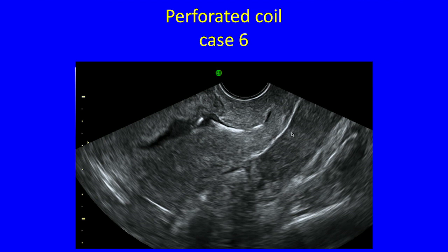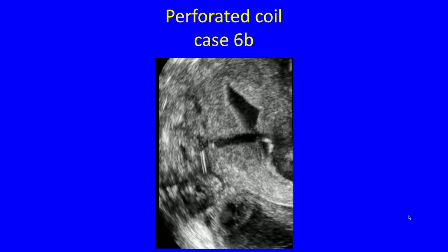And this one, coil strings, you can often see the strings really clearly, and you have to be careful that what you're calling coil isn't threads. If you're saying, the coil's in the cervix, just be sure that that's not thread you're looking at. I mean, it could be in the cervix. But here, we could see something bright here, just to the internal os, and then an empty cavity, and, well, where is it? I rendered it really quick and easy.